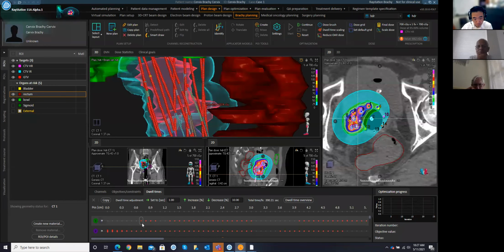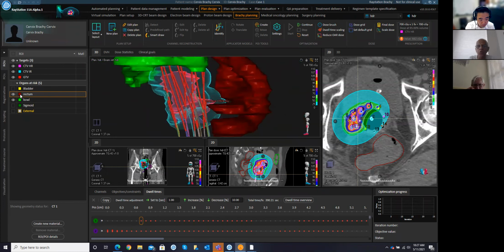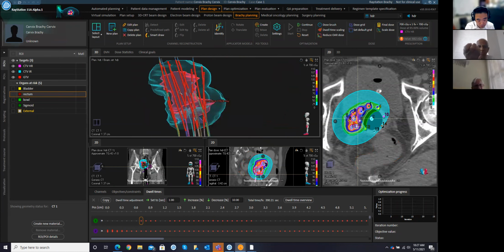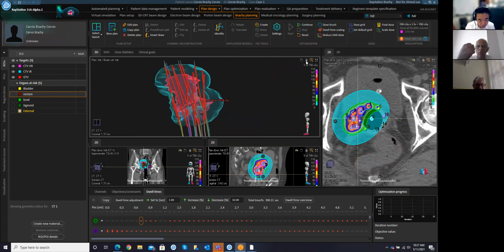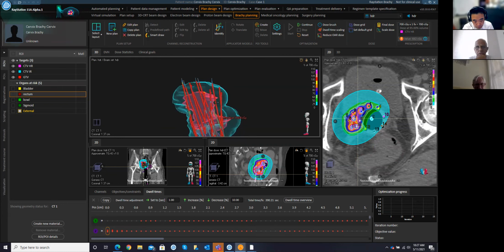I guess I'll ask another question that will determine whether that would actually happen: you only have one way, either from the endpoint, in other words distal or proximal. You don't have both options. Am I correct on the reconstruction?